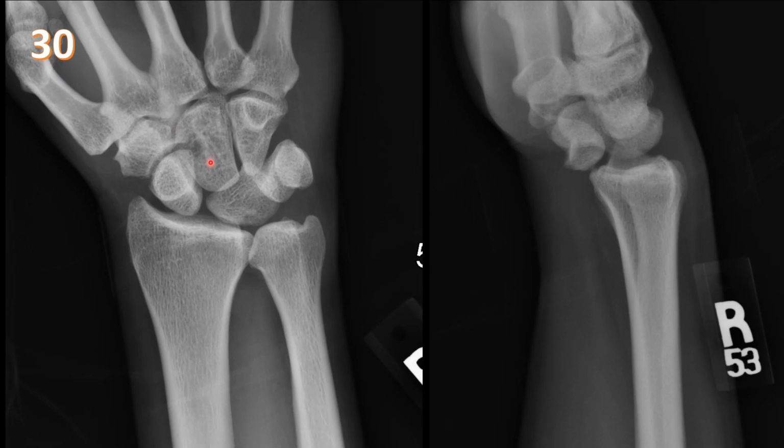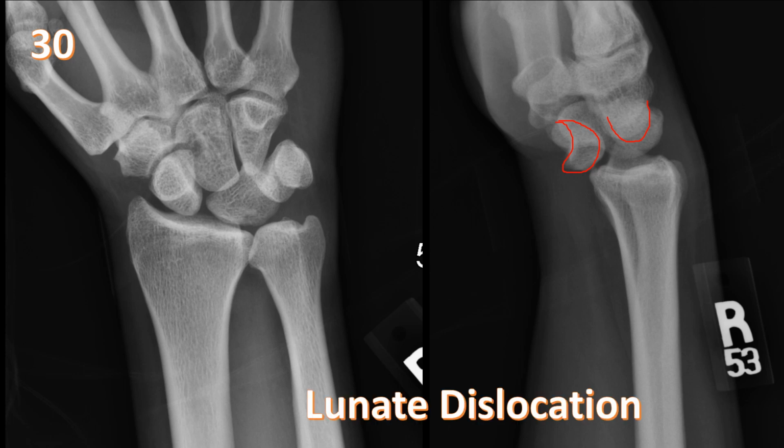In case 30, we have AP and lateral views of the wrist, and we see that the lunate is not really articulating well with the scaphoid, the capitate, or the triquetrum. And in the lateral view, we can clearly see that the lunate is completely dislocated volarly with respect to the radius. So here we see the lunate, and it's not articulating at all with the distal radius, and it's not articulating with the capitate either. So this is a teacup appearance of the lunate, and we see this in lunate dislocation.